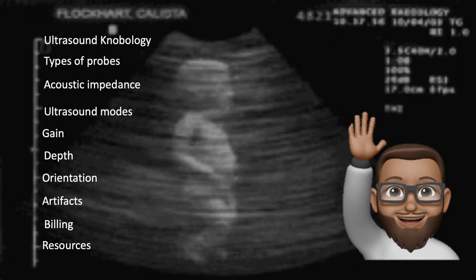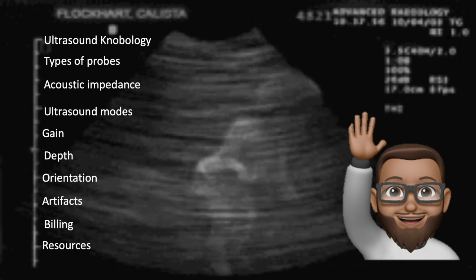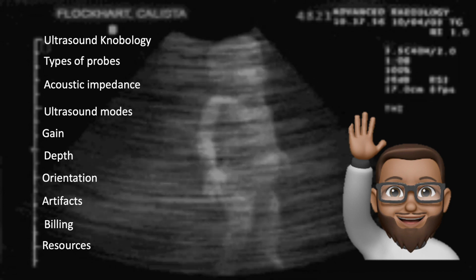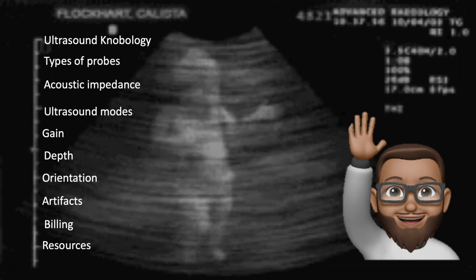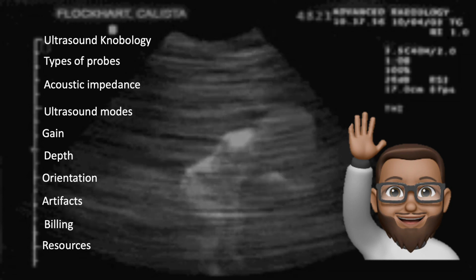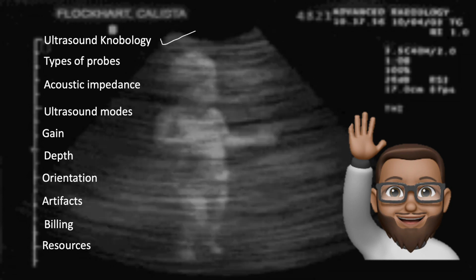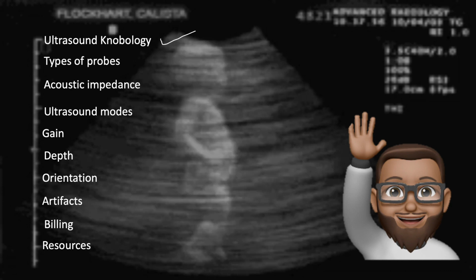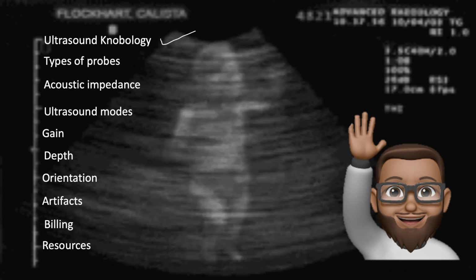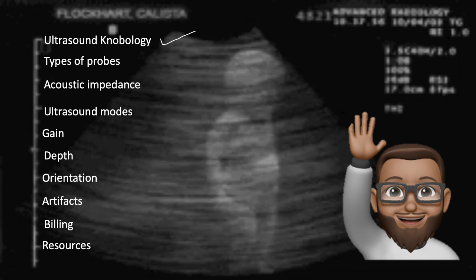All right, so we came to the end. I really hope that you get some benefit out of this video. We touched base on ultrasound knobology really quickly. Knobology is basically a fancy word for how to deal with the ultrasound keys and knobs, which is made much easier nowadays because of the new devices.